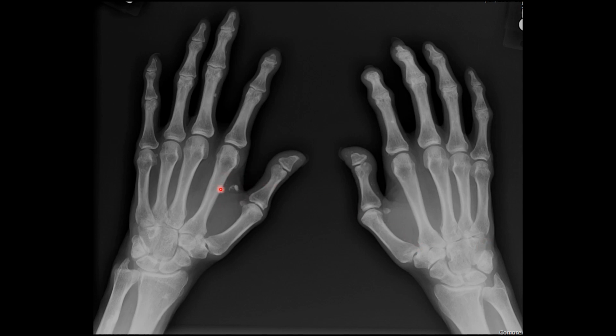We again see some soft tissue calcifications, but we also see some acro-osteolysis and soft tissue resorption. This is a patient with scleroderma, and this is fibrosis of the soft tissues. That's why you see so much resorption, almost like there is no soft tissue, and the acro-osteolysis. And they have multiple calcifications just because of tissue necrosis related to the fibrosis. So acro-osteolysis, soft tissue calcification, soft tissue resorption, consistent with scleroderma in the MSK system.